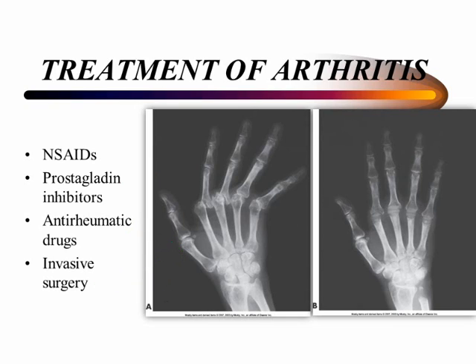In the PA projections of the patient shown here, we can see dislocation and joint destruction of the 2nd to the 5th metacarpal phalangeal joints. In the post-operative image of the same patient, with the digits fully extended, it illustrates the 2nd through 5th metacarpal phalangeal joint implants.